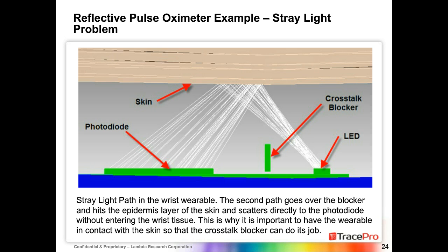You're going to specify the LED, and you're going to specify both its spatial and its angular and its wavelength information. You're going to specify the detector and how well it absorbs light as well. And of course, you're going to have a full 3D CAD geometry, and you're going to be able to specify how each one of those surfaces reflects, transmits, and scatters and absorbs light. So yes, everything will be available inside the program, and you will get irradiance plots that show you how the power goes through every single one of those pieces of the puzzle, which is every single surface in that model. And you can see all of it at your leisure to go through and see how the light propagates.